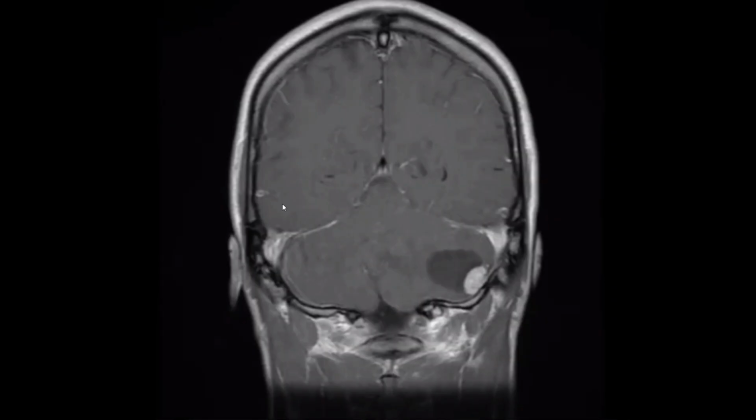If we have a cystic lesion, the more common is pilocytic astrocytoma. Yes, you are right. Pilocytic astrocytoma is more common than hemangioblastoma, unless we have von Hippel-Lindau. That is another situation. Okay, so the most logical thinking here, because this is a young adult patient, the most logical diagnosis is hemangioblastoma.